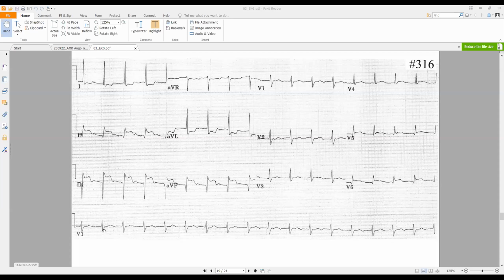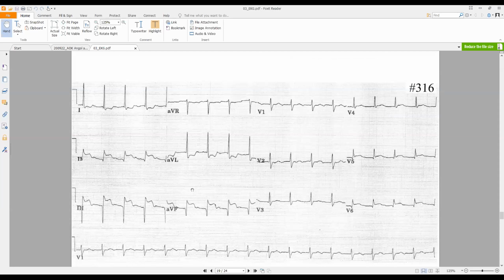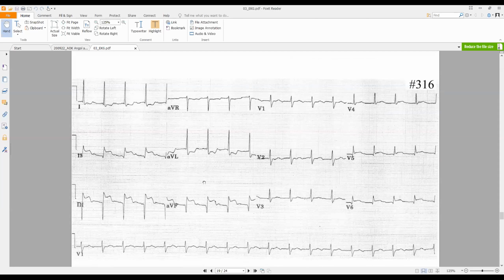Heart rate. Down low, we see a bit less than 3 big squares, so it's slightly above 100. So we're talking slight tachycardia. Now, oh wait, the axes first.